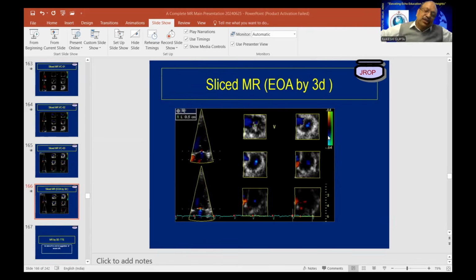Now, how do you measure the LVOT area? LVOT VTI in the 4-chamber view? Three-chamber view. Three, no, not 4. 3 or 5. Correct. LVOT diameter in the PLAX view. So in the PLAX view, get a diameter, divided by 2 will give you the radius, and area multiplied by LVOT VTI. So on one side you're getting a stroke volume across the LVOT. On the other side you're getting a stroke volume across the mitral valve. The difference between mitral flow and LVOT flow.